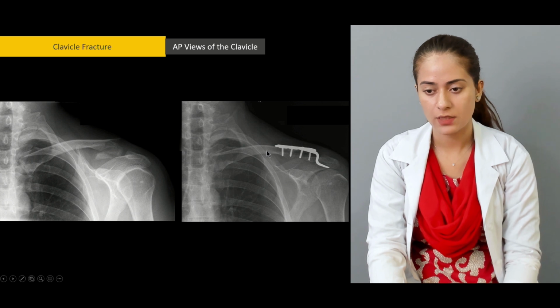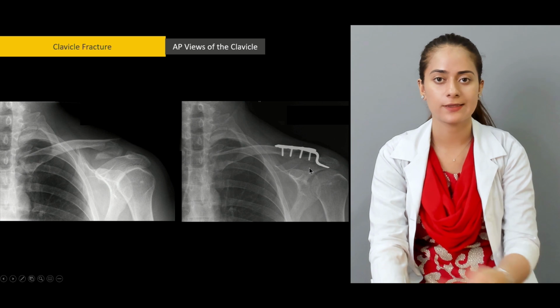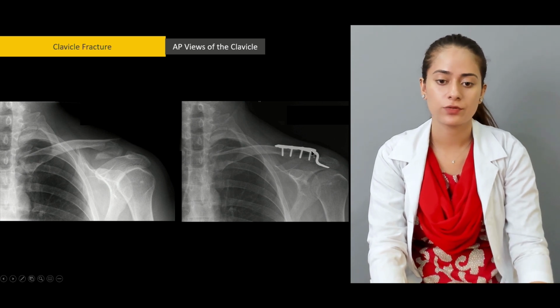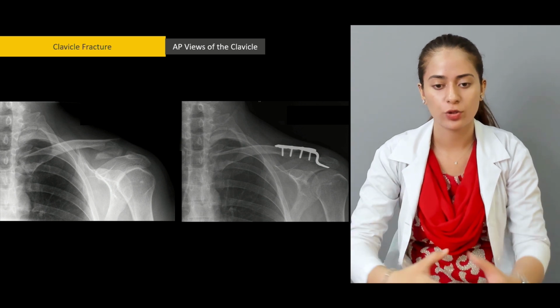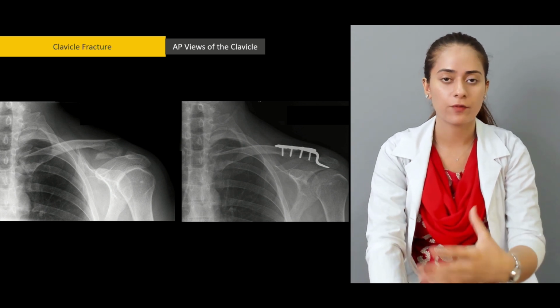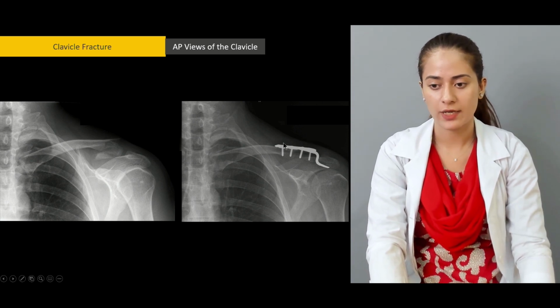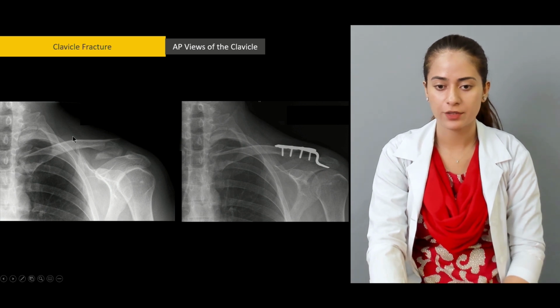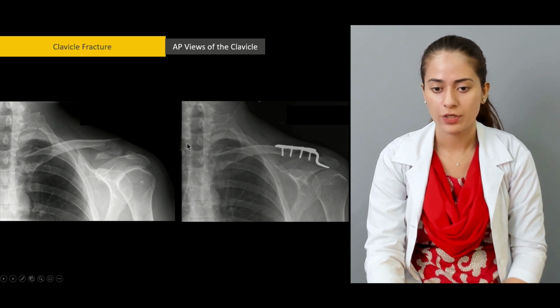And this is the surgical reduction, or this is how it's reduced, the open reduction. Open reduction means it's surgical. Closed reduction means that dislocations are placed in anatomical positions without any surgical intervention. So these are the screws, and a wire could not be placed here because of so many fragments. So screws were adjusted.